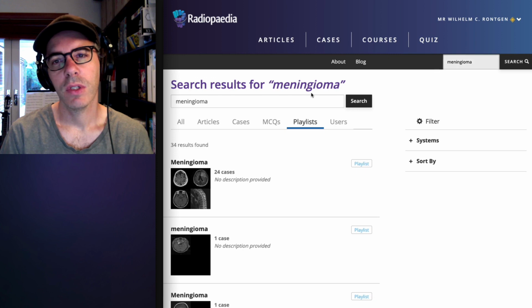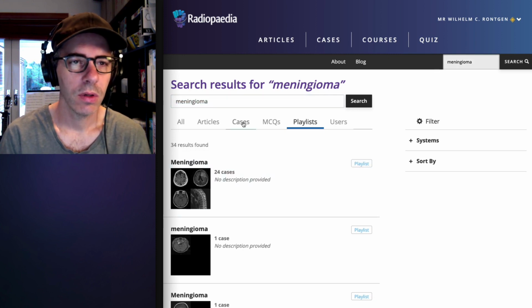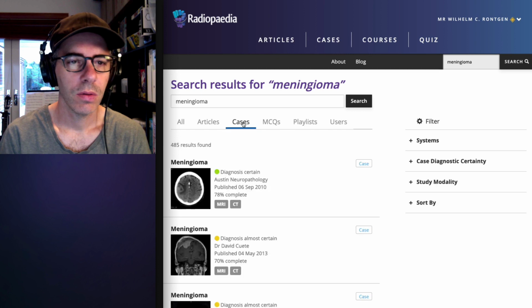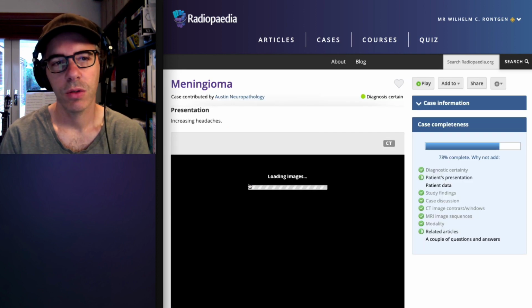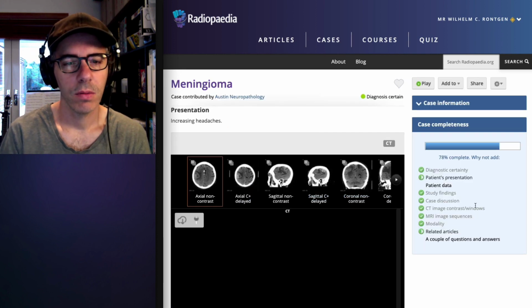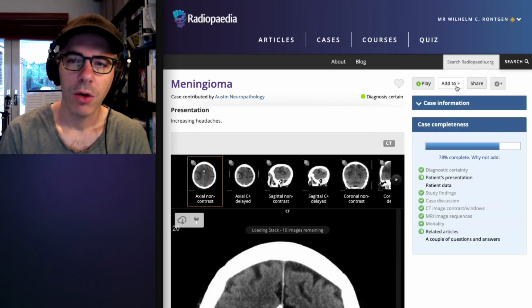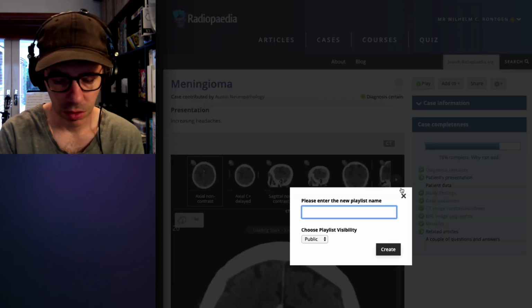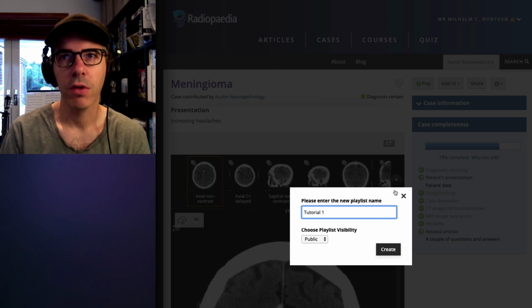So if we wanted to give a neuroradiology tutorial, we could start with this, and let's say we decided that this was a good case to show, which it actually probably is. Simply go to Add To and Add to New Playlist and call it Tutorial 1 or whatever you want to give it.